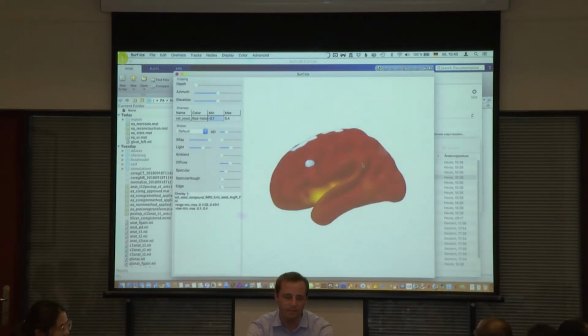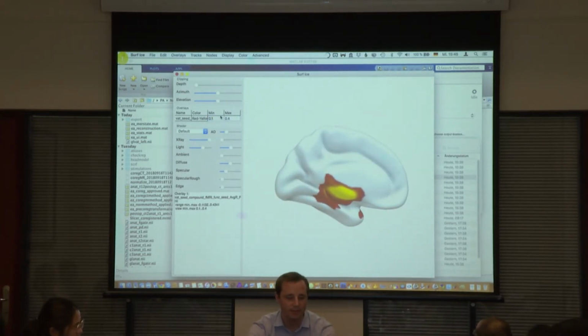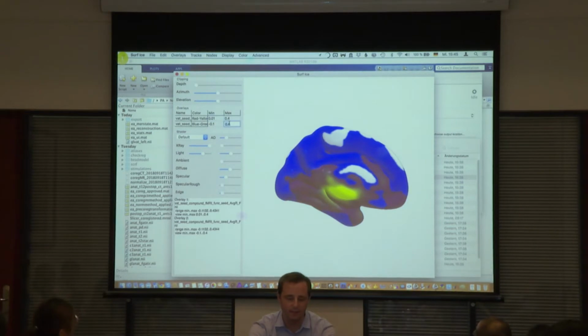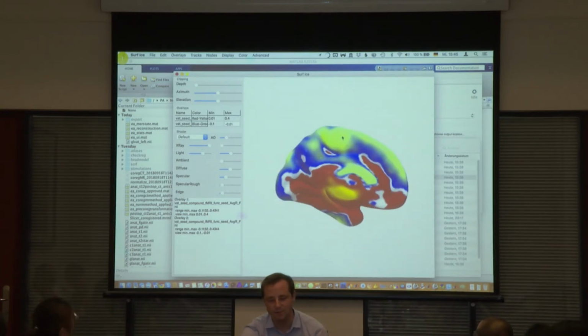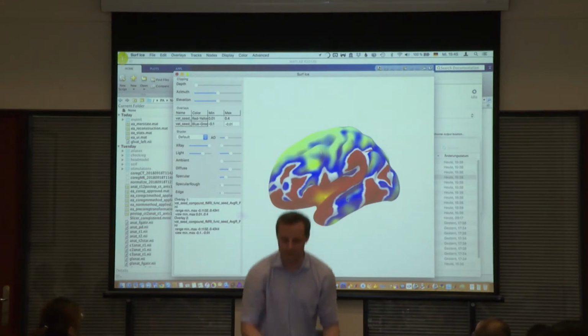You can basically visualize it and say, let's say we want to show functional connectivity like this, and then anti-correlations like this. So you see anti-correlations to motor cortex and then maybe positive correlations to these regions.